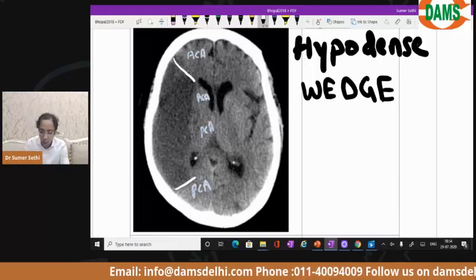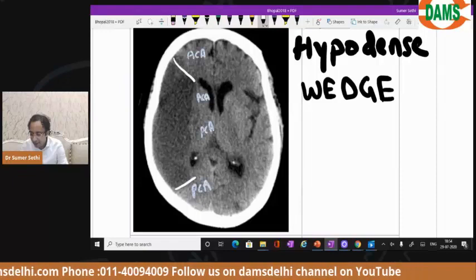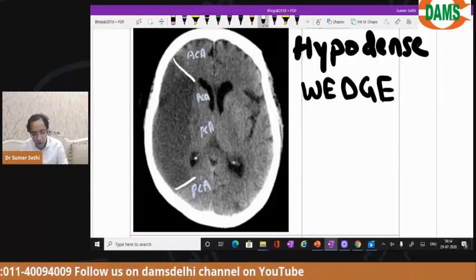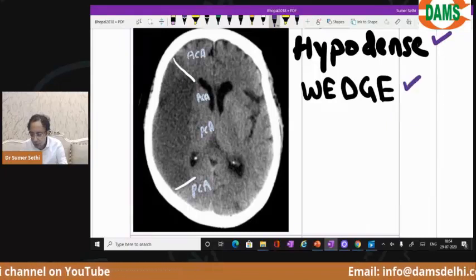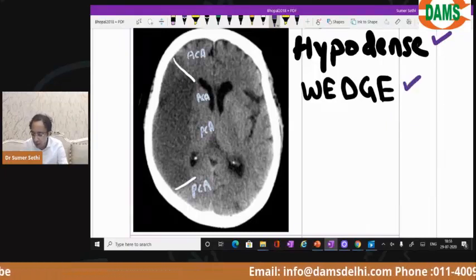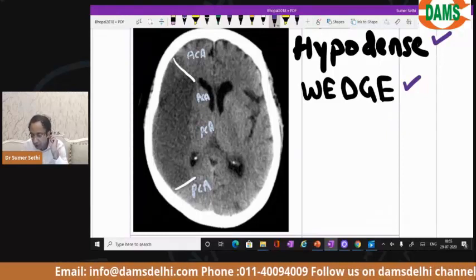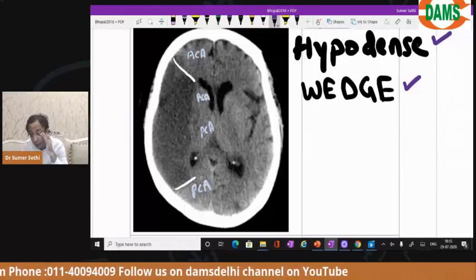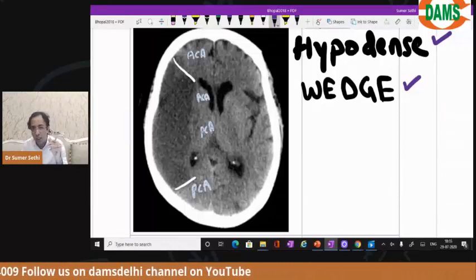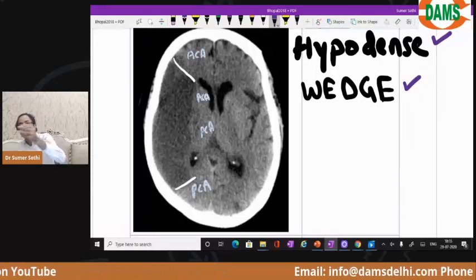Okay, क्या आप बच्चा पार्टी देख पा रहे हैं? Okay, can you see it here or not? You can see a dark disease, hypodense lesion, which is shaped like a wedge. Okay, but let me repeat. Some of you were asking, investigation of choice for cerebral aneurysm is CT angiogram. But the most accurate is DSA, and while doing DSA, we can also coil the aneurysm.